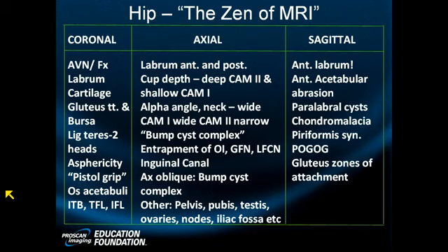Is it pain from a cross-country run? Or is it an infiltrative bone disorder? Is it leukemia? Is it an osteogenic sarcoma? Is it other? I'll give you 10 seconds to decide, but only 10.